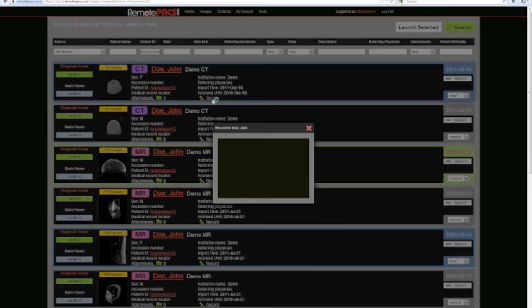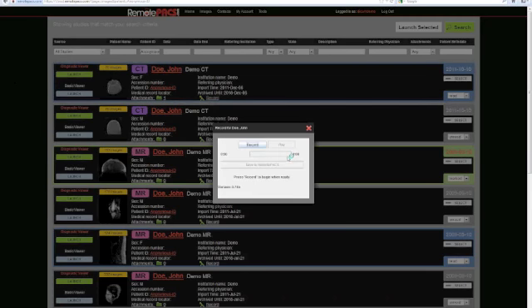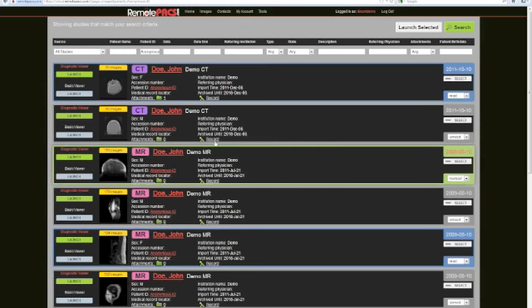There's also a voice note recorder here. It's not the same thing as a dictation, but it will allow you to record quick notes right from your computer's microphone, and anybody else that can access the study can play it back. It's a relatively new feature that we've added.